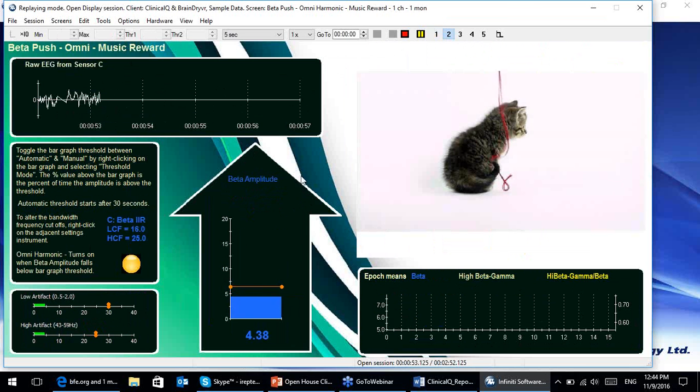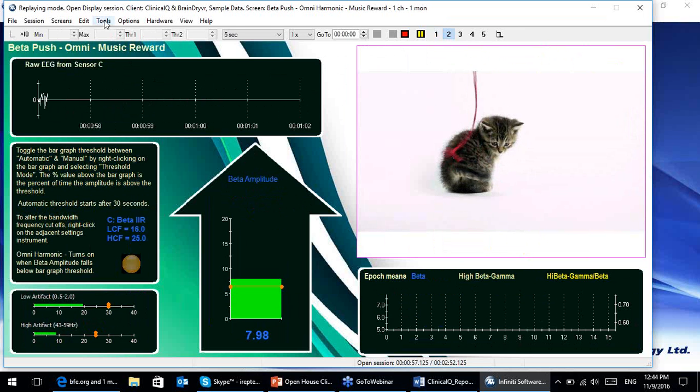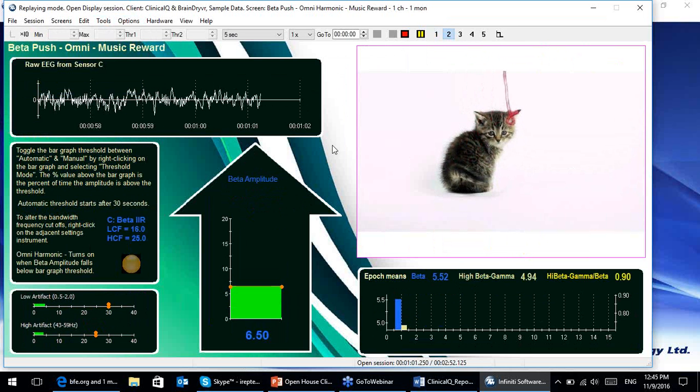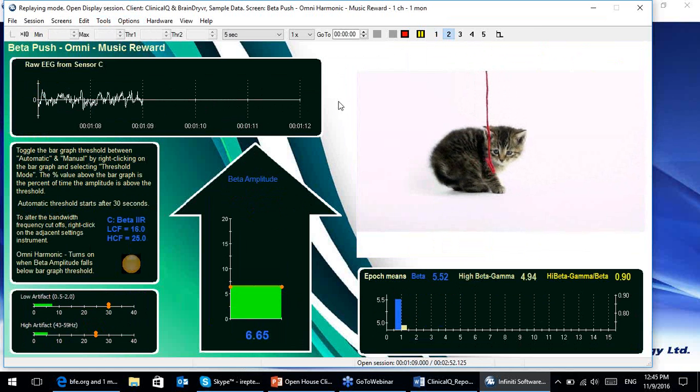If we go to screen number 2, it's the same type of screen, but instead we're using an animation instead of a DVD. And so that's nice and easy to look at. This is my fun little cat animation. I usually have young girls start screaming because they think it's so adorable, and then they sort of get used to it and they stop screaming, and it becomes a little bit better for feedback.